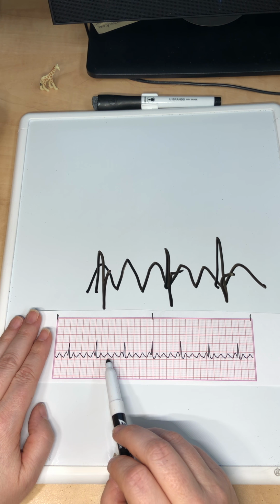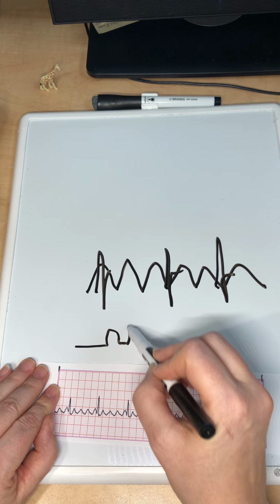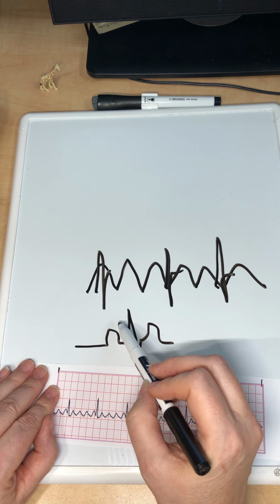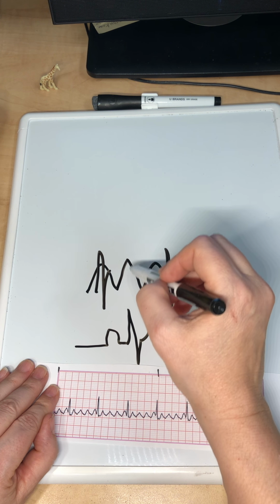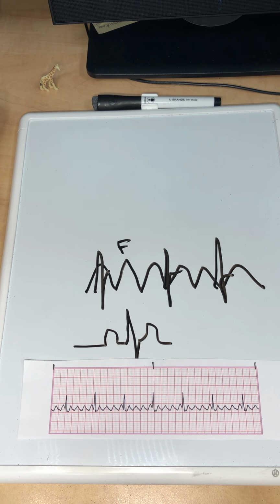What else do I hear people call it? But it just looks jagged, right? It's not a pretty round P, QRST. It's not a beautiful P. It's an F wave. We call this F wave. So this is a rhythm we call A flutter.